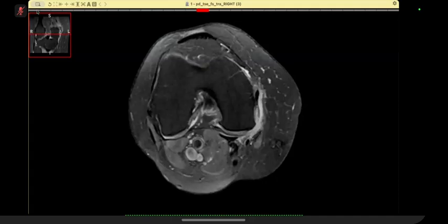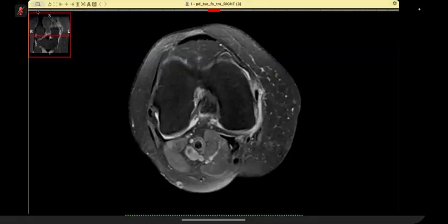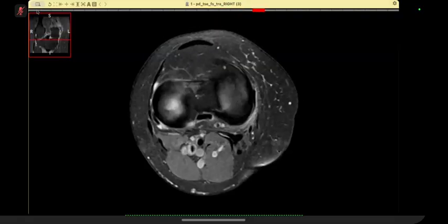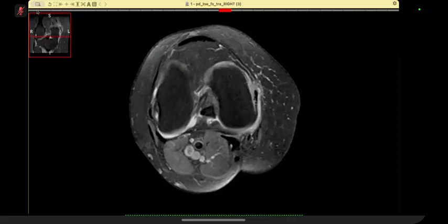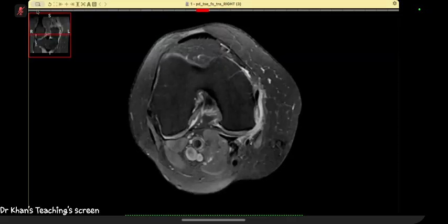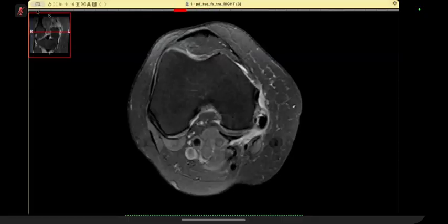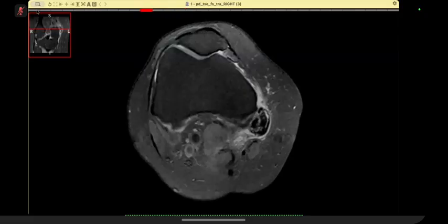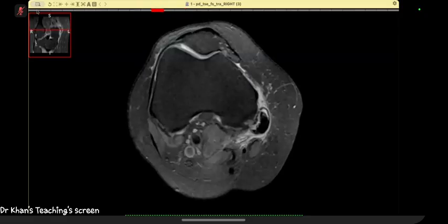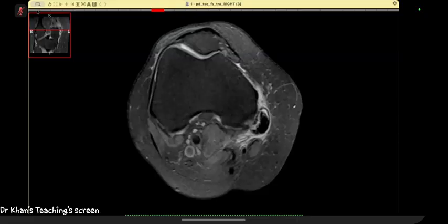I'm trying to establish its association with the femur, and also the medial patellofemoral ligament appears to be disrupted with altered intraligamentous signals. This appears to arise from the posterior medial femoral condyle cortex, where I can see a defect as well in the cortical outline of the femur.